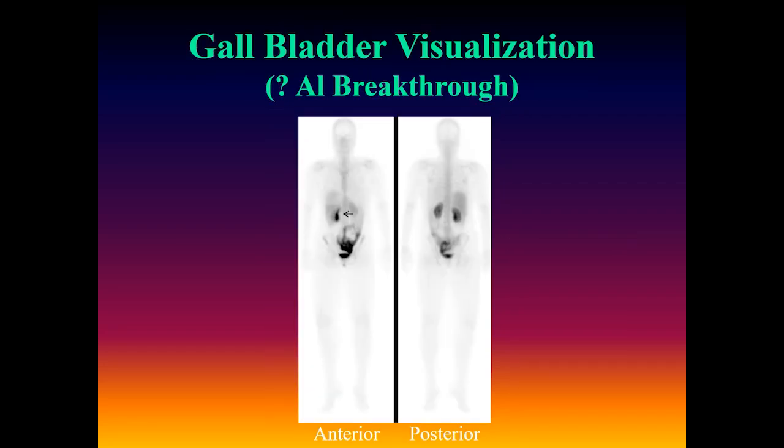Note in this patient there is a combination of gallbladder and bowel activity. This is due to a technical failure with the preparation of the bone agent. It may in fact be secondary to aluminum breakthrough.